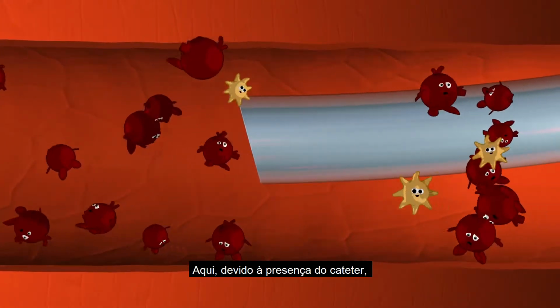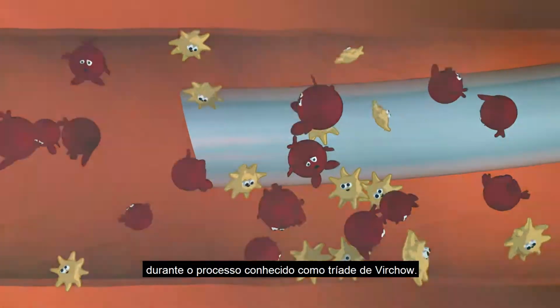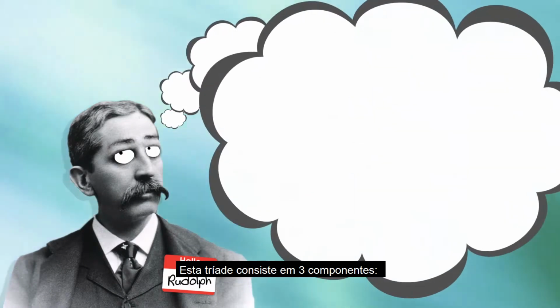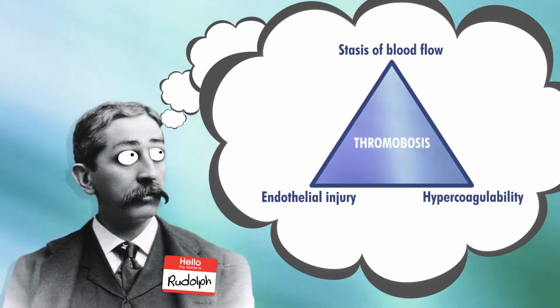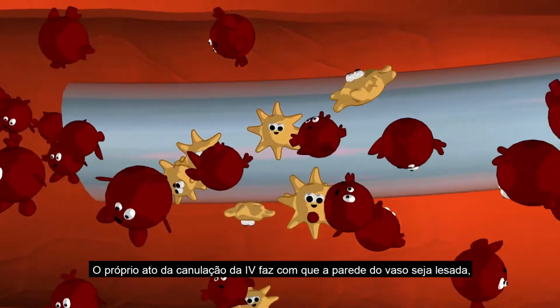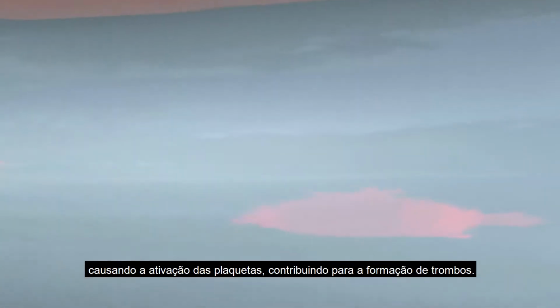Here, due to the presence of the catheter, blood flow is slightly slower than normal. Over time, platelets will transform, during the process theorised in Virchow's triad. The components of this triad are stasis of blood flow, endothelial or vessel wall injury, and hypercoagulability. The very act of IV cannulation causes the vessel wall to be injured and interrupts blood flow due to the space it occupies, which causes the activation of platelets, ultimately contributing to thrombus formation.